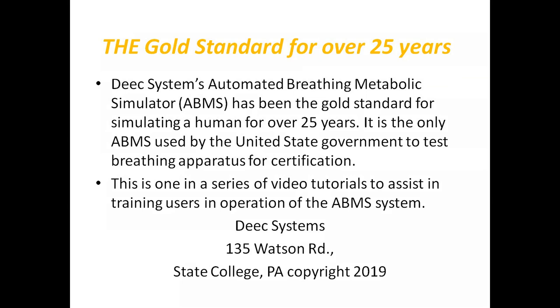Welcome to the Deec Systems Automated Breathing Metabolic Simulator video tutorial series, often called simply the ABMS. These videos familiarize current users and prospective users with the ABMS operation. These videos demonstrate some of the many features to maximize simulation accuracy and ease of use for the user.